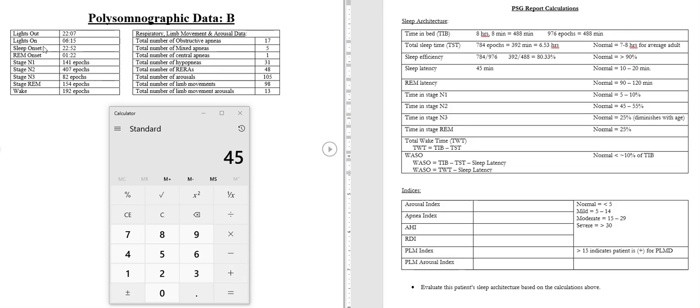So the distance between sleep onset and REM onset is 2.5 hours. If dealing with these little numbers is difficult, like 52, 22, another thing that I've done in the past to make it work easier in my brain is I'll round up. So like 22:52, I'll round up to 11 p.m. So from 10:52 to 11 p.m., that's 8 minutes. And then 8 minutes on to here, so that's 1:30. So the difference between 11 p.m. and 1:30 a.m. I don't know if that helps, but essentially, use your fingers if you need to, because I certainly do. You're just counting the difference between this time and that time. And it was 2.5 hours.